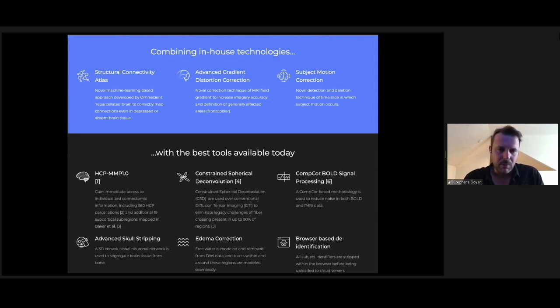Another important type of correction we're applying is a free water correction. So if you have patient scans that have free water in them, this gets canceled out from the DTI imaging. So that's basically the short list of everything that's happening under the hood. There's obviously another set of proprietary algorithms running in there, which produce the results you've seen.